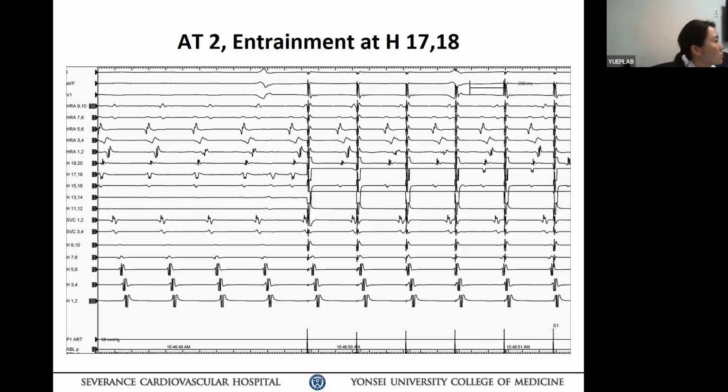So you see just the endocardial activation pattern, but sometimes there's a missing point. And the epicardial conduction you cannot visualize in the 3D mapping. So imagine how the reentry circuit is going on. Okay, any other question? Let's go ahead.